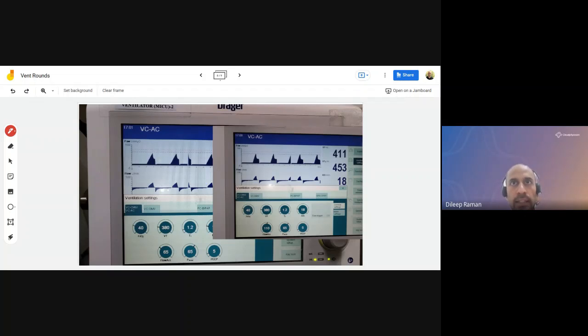Prashant: Can we say flow acceleration corresponds to rise time? See, fundamentally, yes. From a mathematical perspective, rise time and flow acceleration would be the same thing. However, rise time is the slope for the first part of the breath in a standard pressure control ventilator. Let me just minimize this and answer your question. It's a good question, actually.